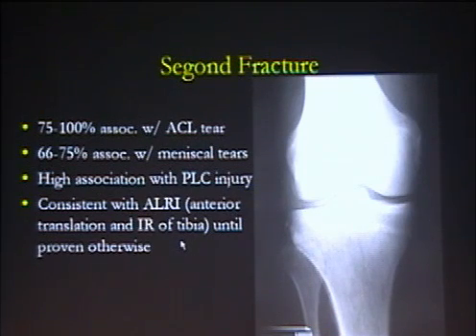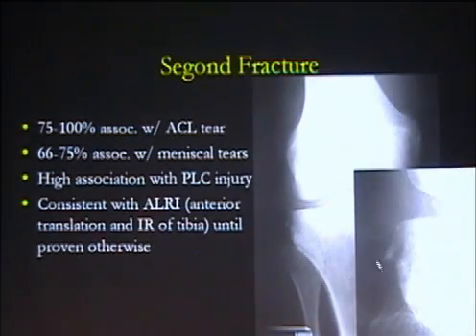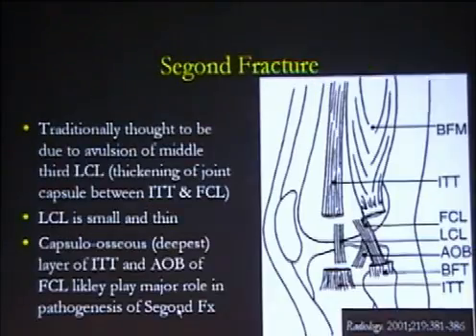It can be very difficult to see, as in this case. You know, it's very tough to see. You need to check every x-ray for this. Avulsion of a small fragment of bone from the lateral margin of the tibial plateau.